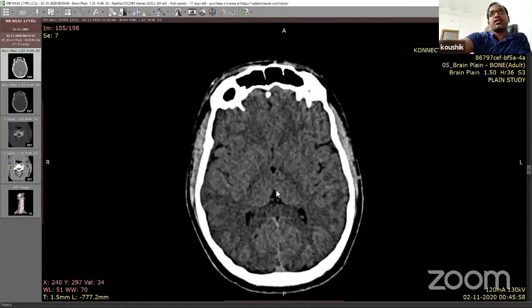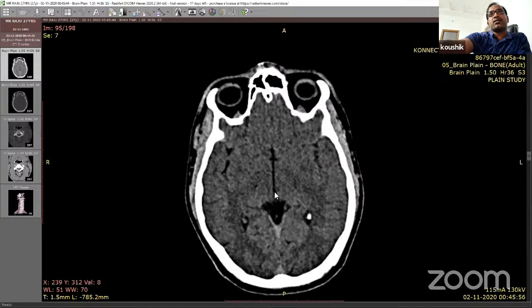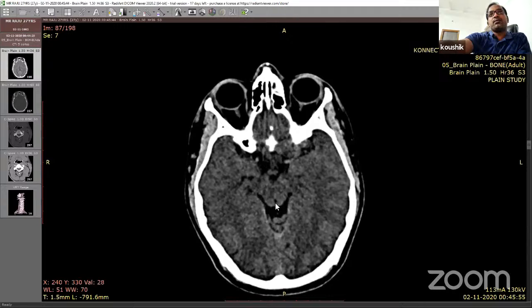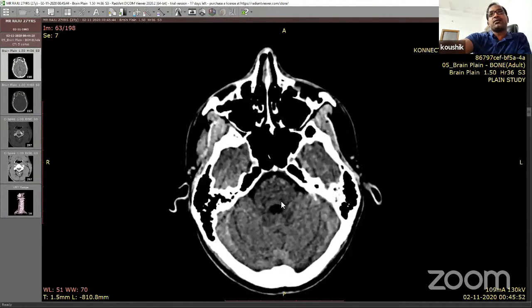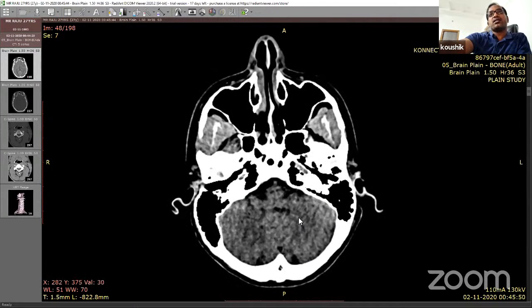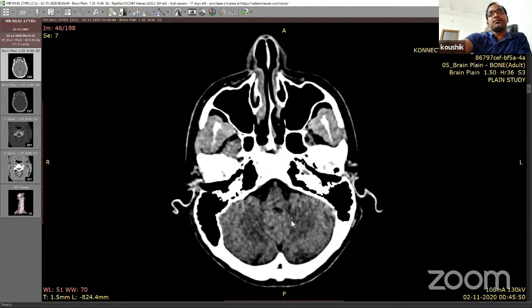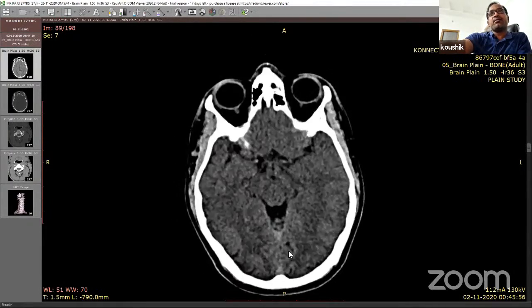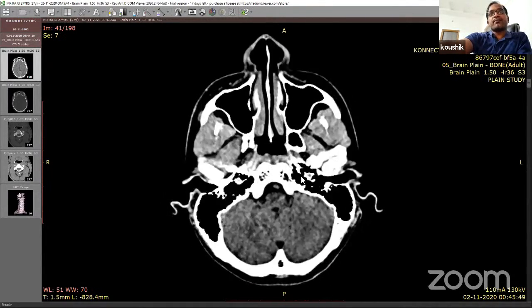This is the third ventricle. Then from the third ventricle, we have this aqueduct. This is a dot we are seeing. This is the aqueduct. If you trace it, it will go into the fourth ventricle. This is the fourth ventricle. From the fourth ventricle, there are two openings on either side, medially Magendie, laterally Luschka, by which the CSF will be drained into the cisterns, the basal cisterns.